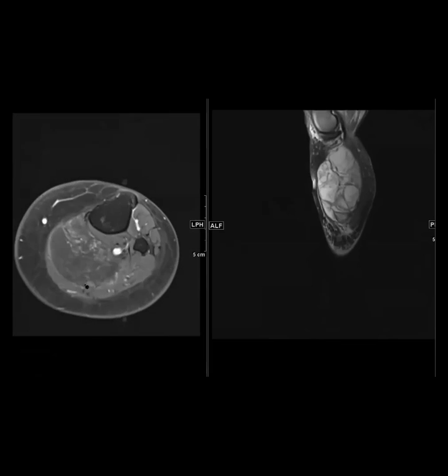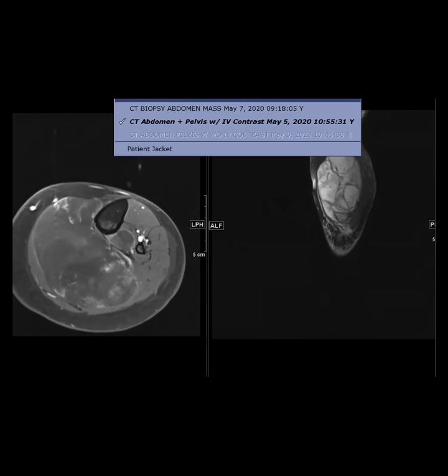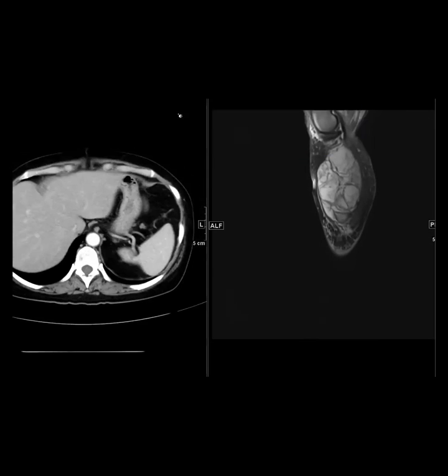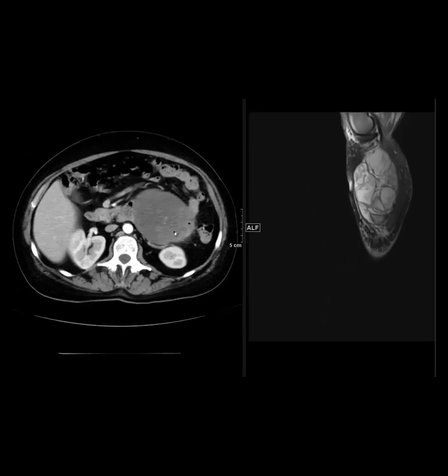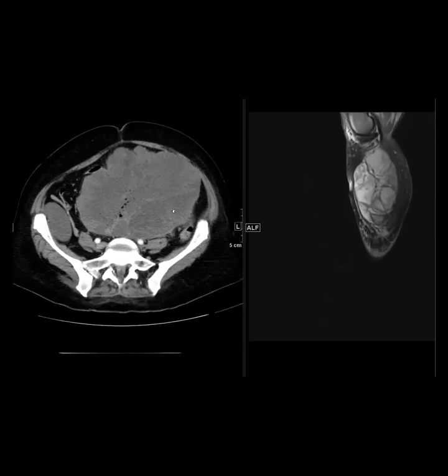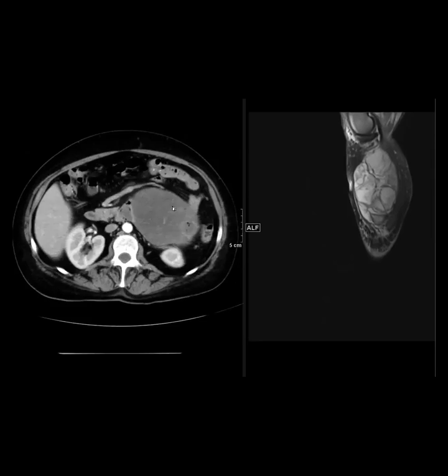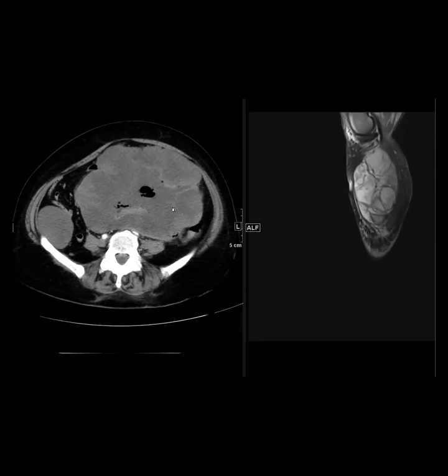Do we have an MRI of the met? No, of the abdomen, no. Yeah, to see if it has the same type of signal. No, liposarcoma was not even on my radar here. You would have said met if we knew the primary. Yeah, that's great.